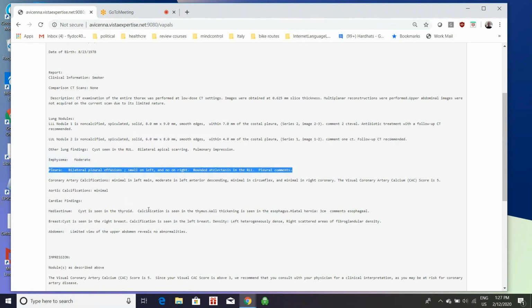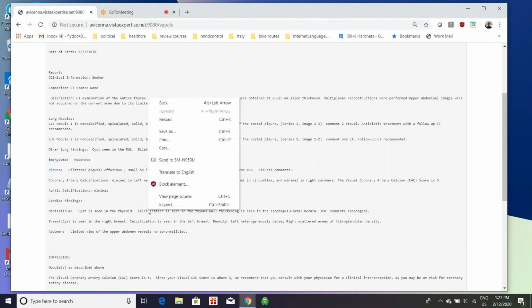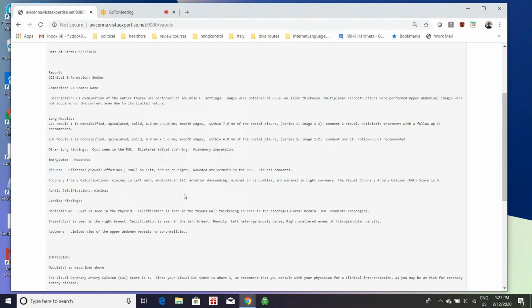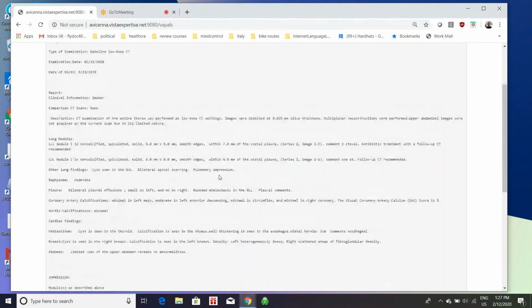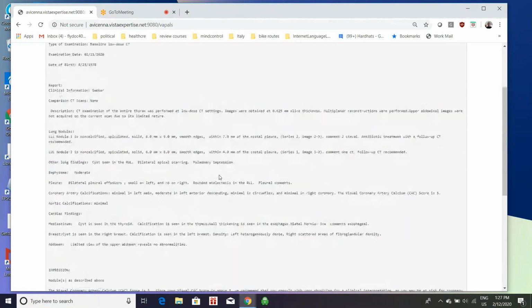So I would characterize this, it's not a formatted text report, obviously. We leave it to PowerScribe to do things like word wrapping and things like that. But this is what I would call raw text. So this is the raw text that would be an input to the PowerScribe system that assists the radiologist in creating the report that then gets filed into Vista for the scan.